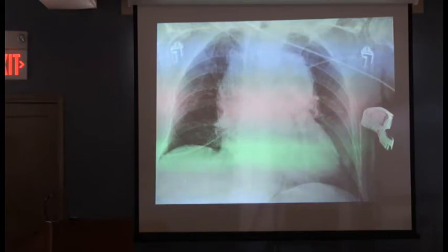Let's jump to C, circulation. All right? Heart pretty darn big. Whoa. That's the wide mediastinum. We generally like to have 8 centimeters or less. This is probably about 10 centimeters, 12 centimeters. The aorta that we normally see coming down nicely is blunted. It's gone. All right? This is very concerning.